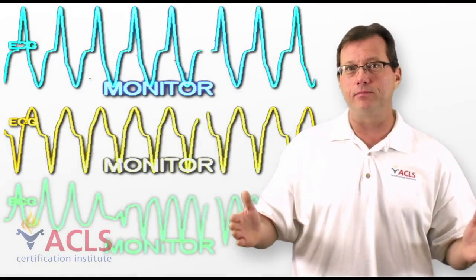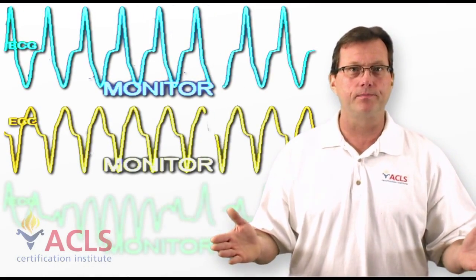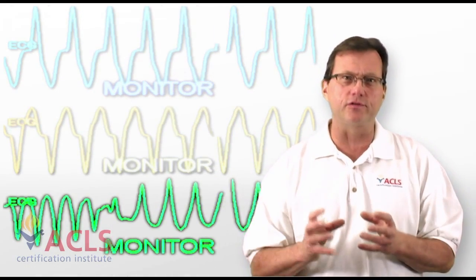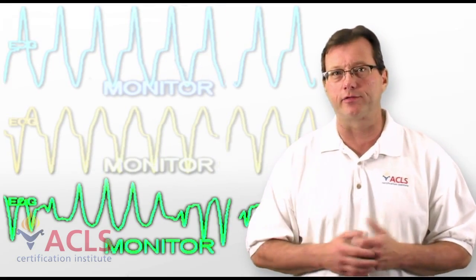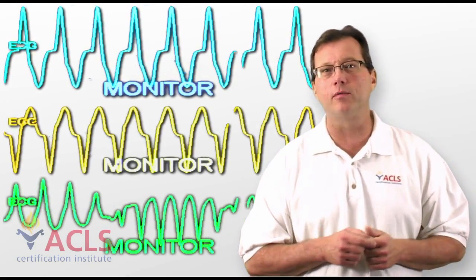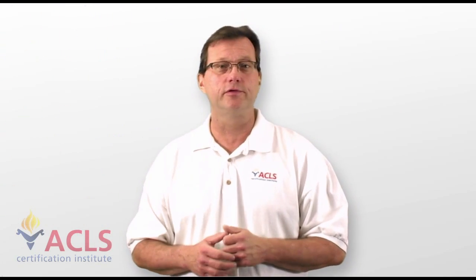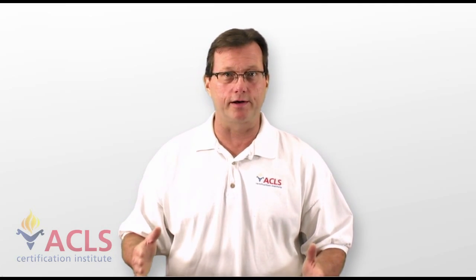If it's the same, well, that's a monomorphic wide complex tachycardia. If the morphology changes, if the complex changes its look, then we call that a polymorphic wide complex tachycardia. And the treatment's a little different. But first, let's start with monomorphic wide complex tachycardia. In this case, we have a patient who's in ventricular tachycardia, wide complex ventricular tachycardia.